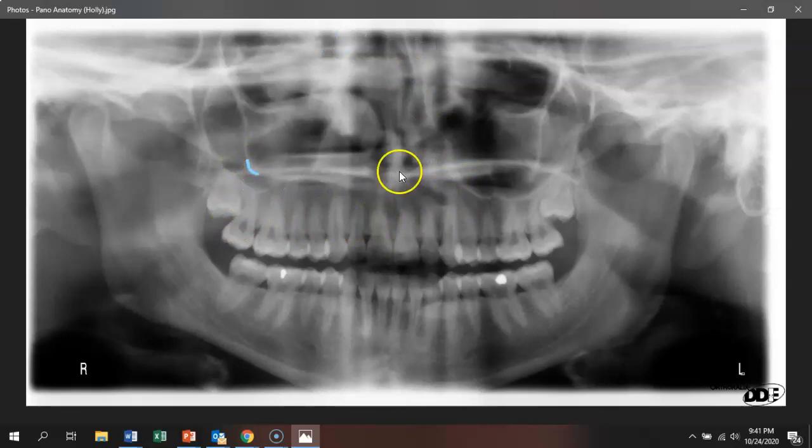Right about here and in here would be the zygomatic process from other examples. It's a little tricky, I think. Again, things like the articulating eminence, you're going to see up around and in front of the condyle. I think actually it might be more down here.